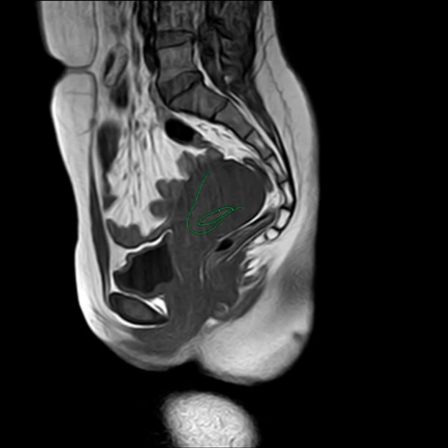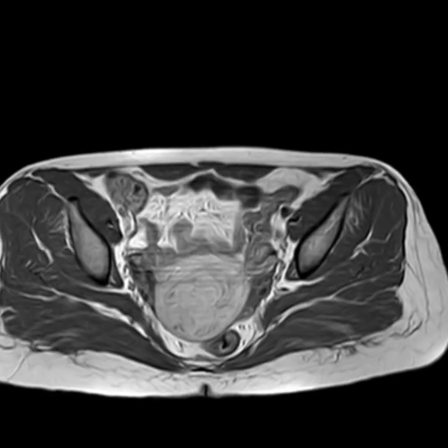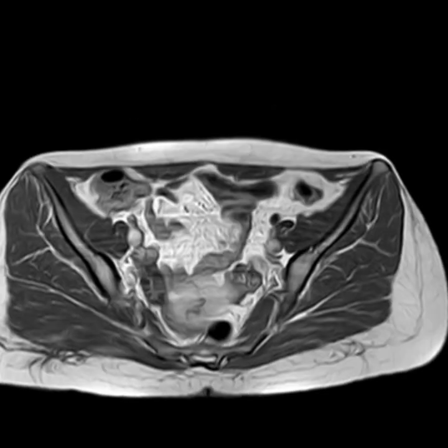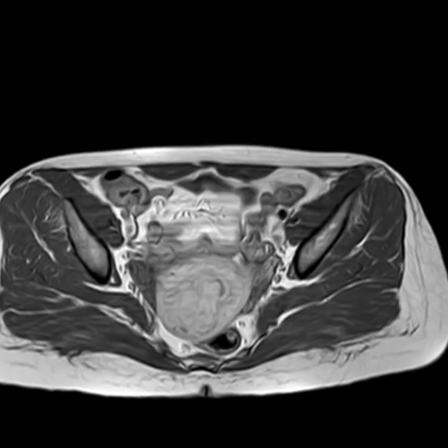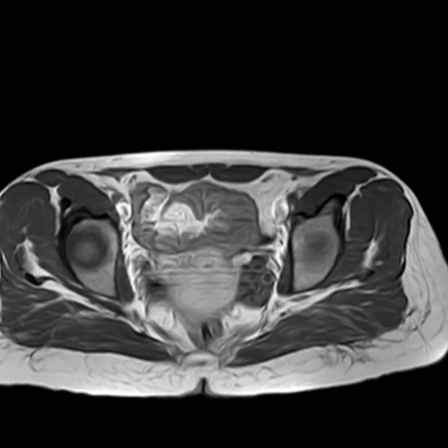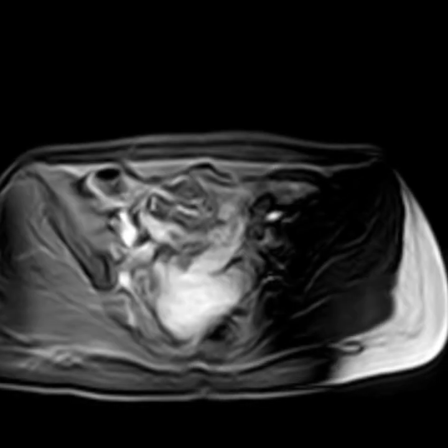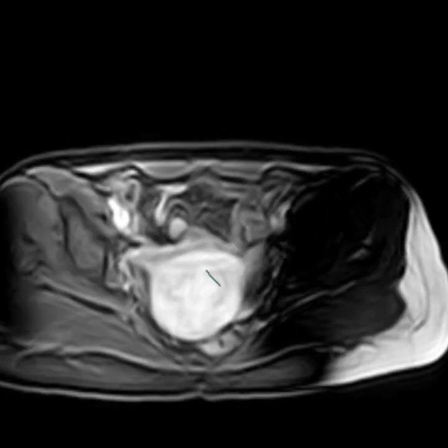Wow, you're good. No, thank you, sir. So, these are the axial, non-fat saturated post-contrast images, and we can see prominent vessels supplying the lesion within the endometrium. And if we go to fat-saturated T1 weighted images, like here, we can clearly see that the lesion is showing diffuse homogeneous post-contrast enhancement.